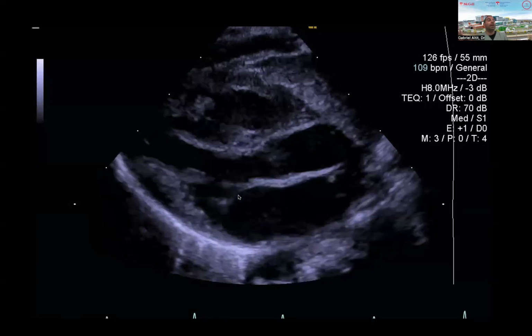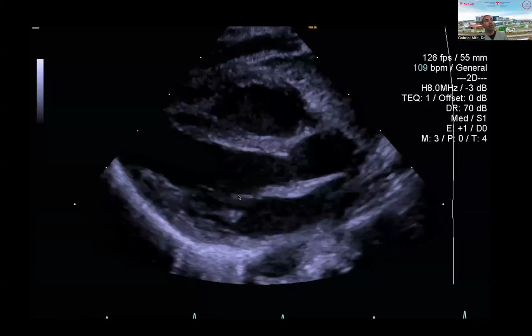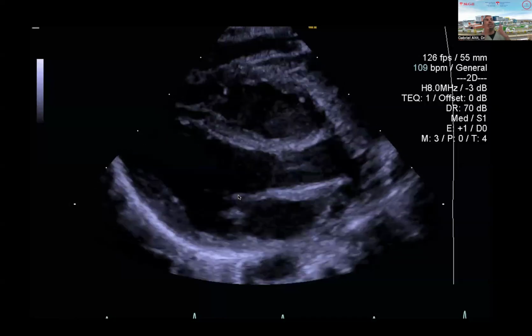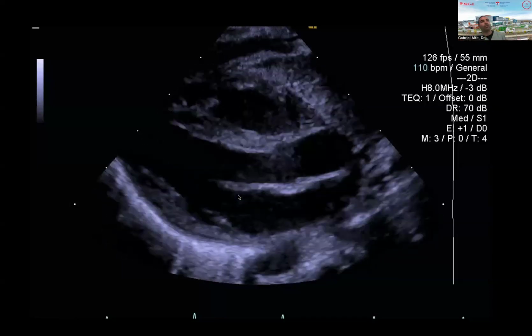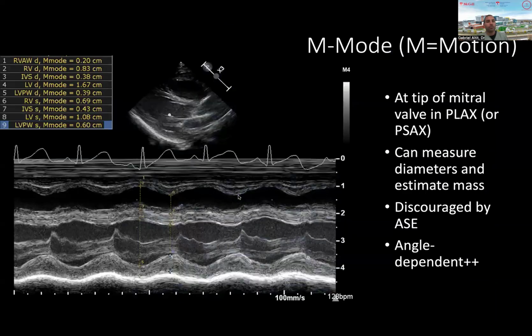And part of their treatment might actually be to raise the SVR so that when the aortic valve is open, it stents this LVOT and it removes the apparatus of the mitral valve from the way. And there's actually more and more in adult cardiomyopathy where they look at these measurements to predict those patients that will end up with severe outcomes, but that's not for us yet.